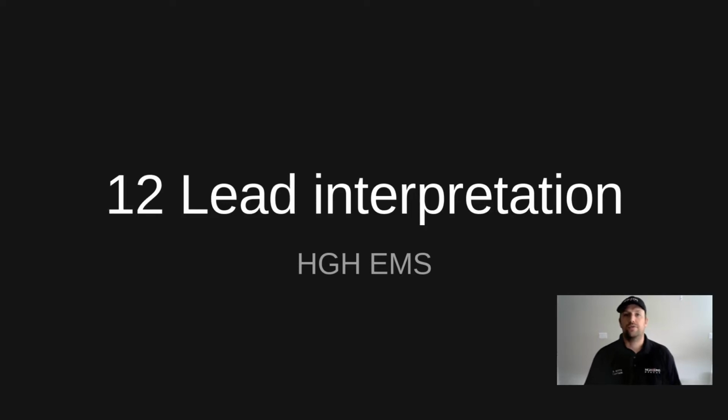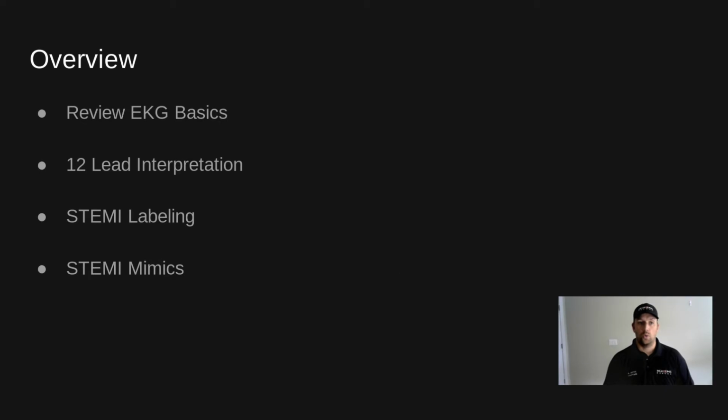In this video, we'll review how to approach 12-lead interpretation. We'll review EKG basics as it pertains to sinus rhythm, review the 12-lead interpretation steps, look at how to label STEMIs, and finally we'll finish up with some STEMI mimics.